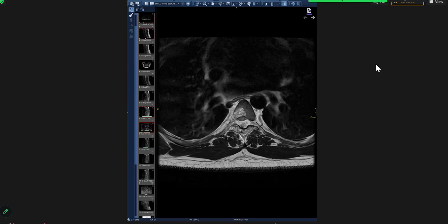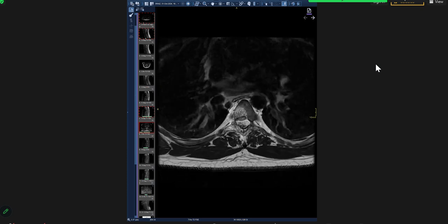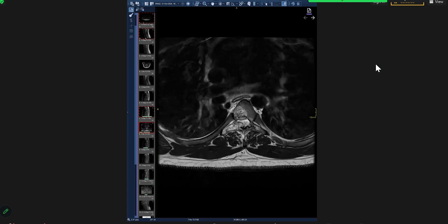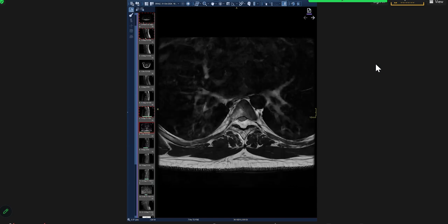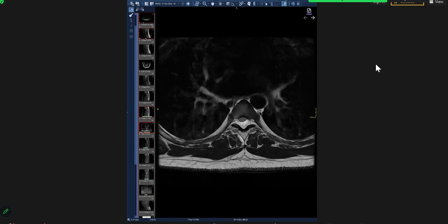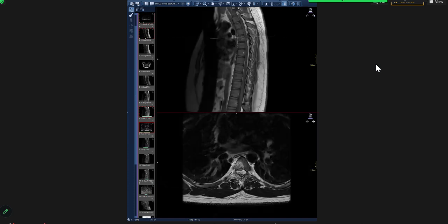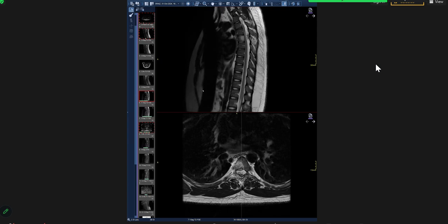So obviously the nerve root is going to be compressed here. And then it has an extra osseous component as well. The most important point is to see this corduroy pattern here. This is the corduroy pattern which you typically see with hemangiomas. And when you see this, you say that this is a hemangioma, but it is an aggressive hemangioma because of the extension into the spinal canal and the way it is narrowing this thoracic cord, so to prevent the patient from permanent disability, because the patient could be paralyzed.